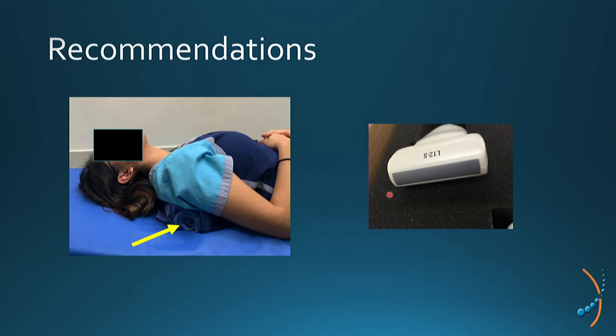The majority of abnormal glands demonstrated will be hypoechoic and hypervascular on Doppler ultrasound. Polar feeding vessels are also a typical and useful observation. These are seen at the caudal part of the inferior parathyroid and cephalad part of the superior glands.